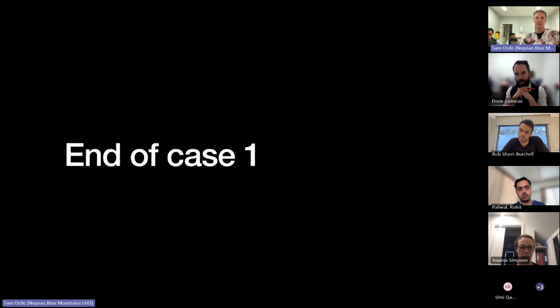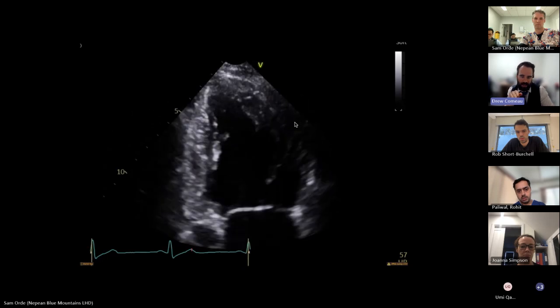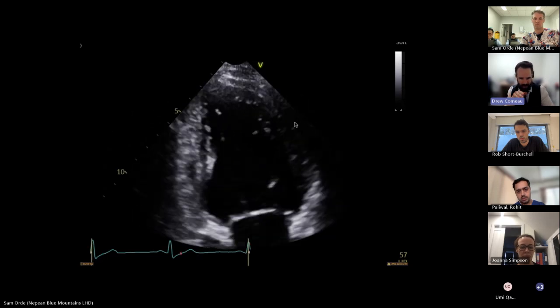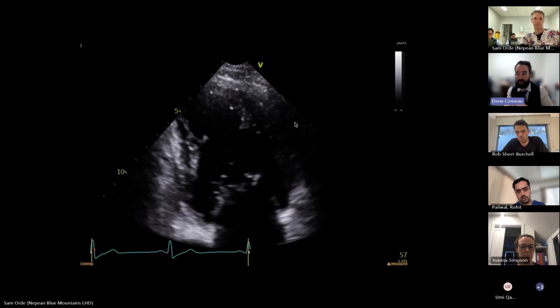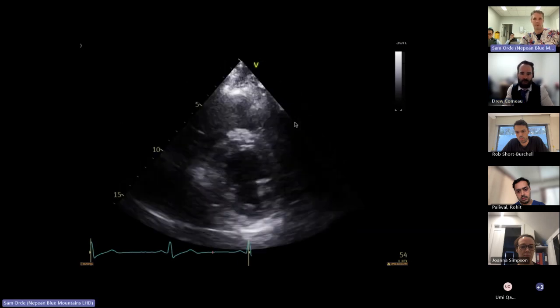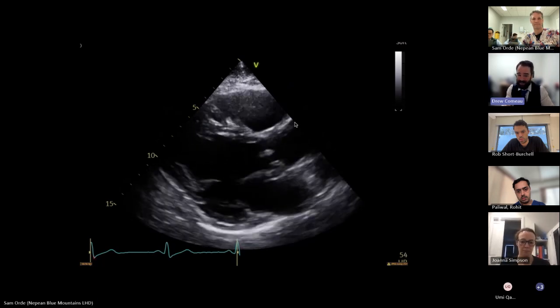So tell me, how do you tell if it's acute or chronic? Right. So in determining acuity, in a patient with a chronic infarct, you'll see scarring and thinning of the wall. You may see some dyskinetic portions and even aneurysms. Nice. So what do you think this one is? Look, I think in the inferior lateral wall that it is thinned. I think this is chronic.